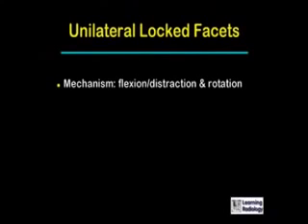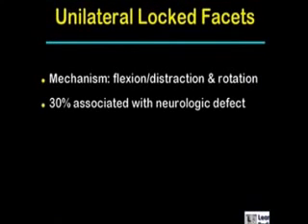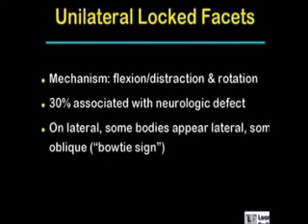When there are unilateral locked facets, which are caused by a combination of flexion, distraction, and rotation, there's about a 30% association with neurologic deficits.